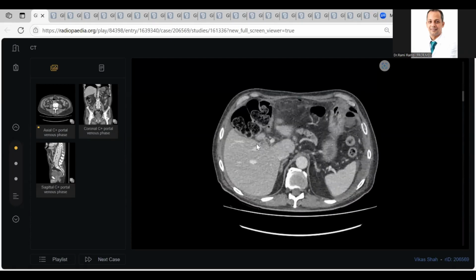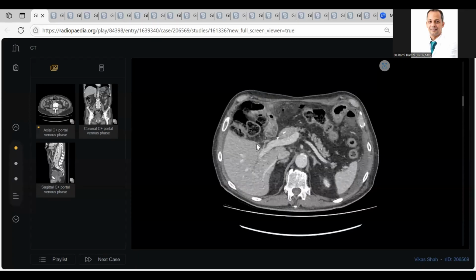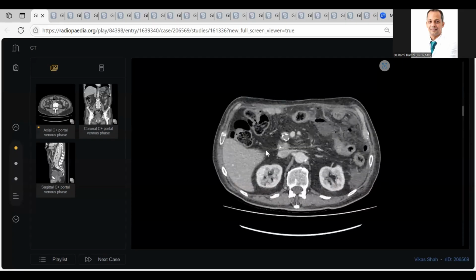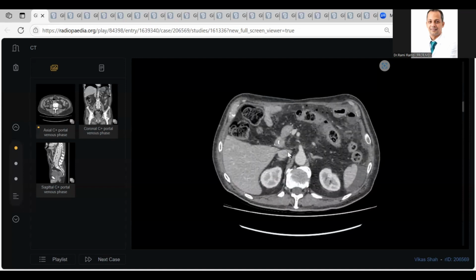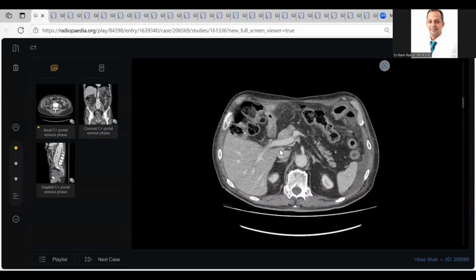When you are scrolling, you miss many important life-saving findings. Okay. So I'm just trying to look at the vessels and the vasculature. The patient has severe post-operative pain. Okay, severe post-operative pain.